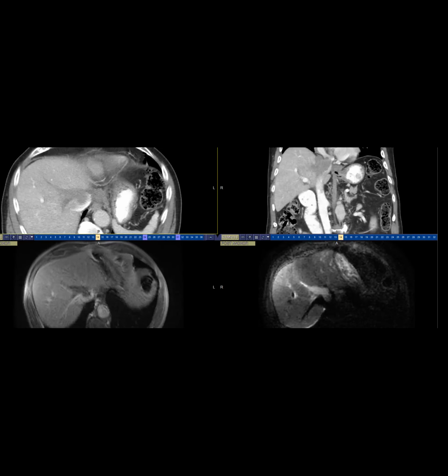So this was, sorry? Fibrolamellar? Yeah, so actually there was part of it in the liver, but there wasn't any arterial enhancement or washout. It was showing this high grade of restriction, and the epicenter was mostly within the IVC and part within the liver, as you can see here. So this was biopsied and actually turned out to be a lymphoma with primary involvement basically of the IVC.